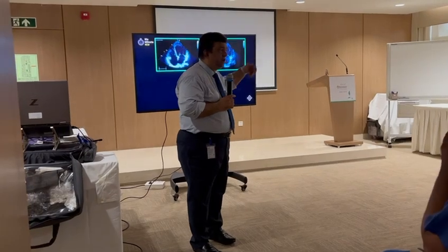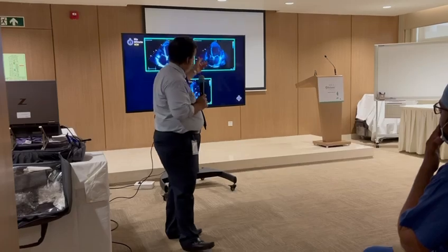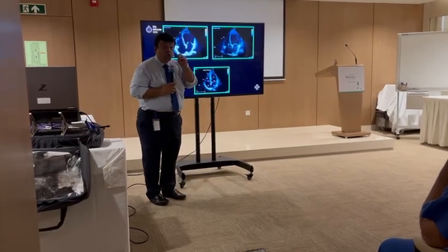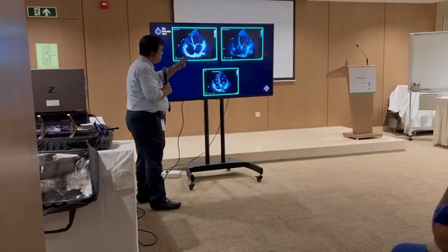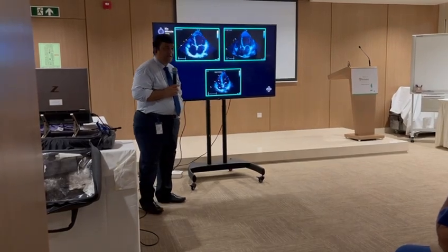You have to see multiple views, a short axis view, perhaps looking at the apex, whether there is any LV apex clot or not. So one view is never enough, but it gives you a suspicion there that I need to look at the apex closely in different views. Parasternal long axis, apical short axis, you need to look at that. What else is seen there? What are the abnormal things in that echo?